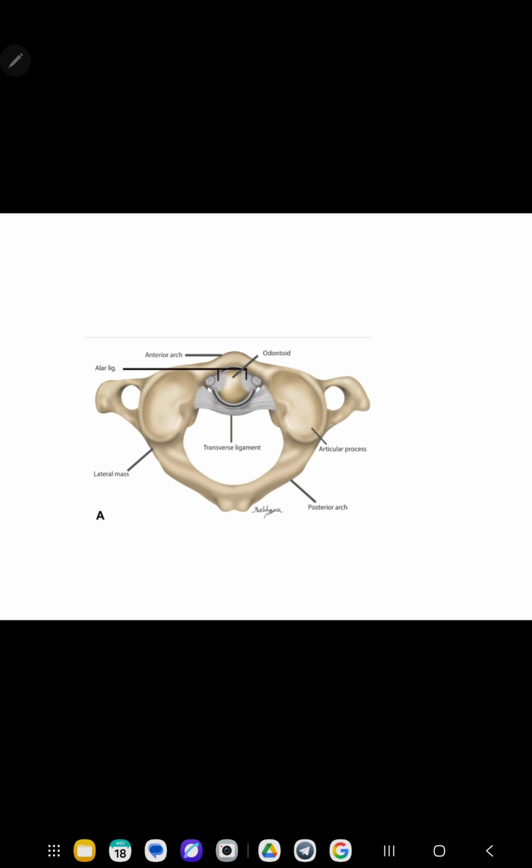That is for the passage. This is present in cervical vertebrae C1 to C7, and from C1 to C6 you can see the vertebral artery within this foramen transversarium. In case of atlas vertebra, this is where the vertebral artery is taking a loop and it is ascending upwards into the foramen magnum.